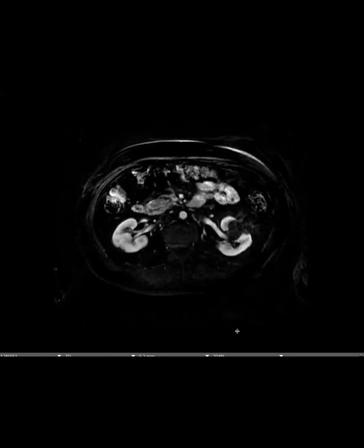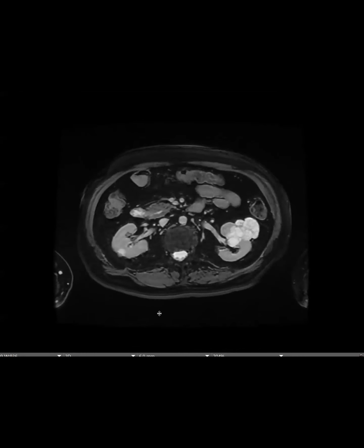Yeah, they're both benign, but they're Bosniak 3s, and so they end up as Bosniak 3s, and you have to have a high index of suspicion for MEST for it not to end up in a urologist bucket. So have we figured out a way to separate a MEST versus a Bosniak 3?